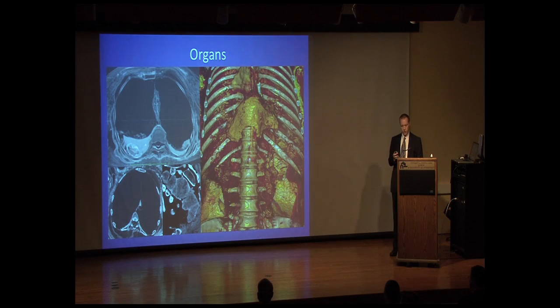The lungs and heart are readily identifiable by their position. The heart, when it's retained in the chest, appears as a dense mass suspended in the pericardium, while the lungs remain as thin, flat structures in the dependent portion of the thoracic cavity, not pictured here, and may appear as patchy opacity in chest films.